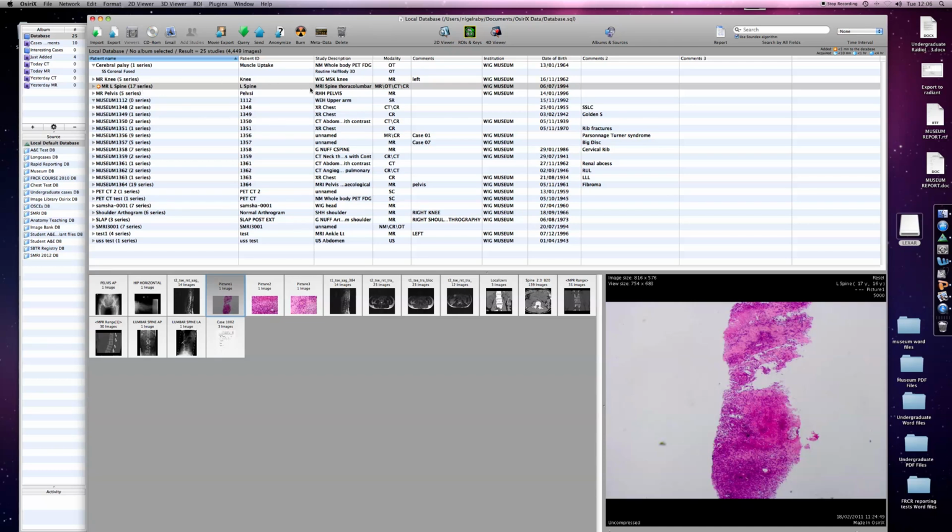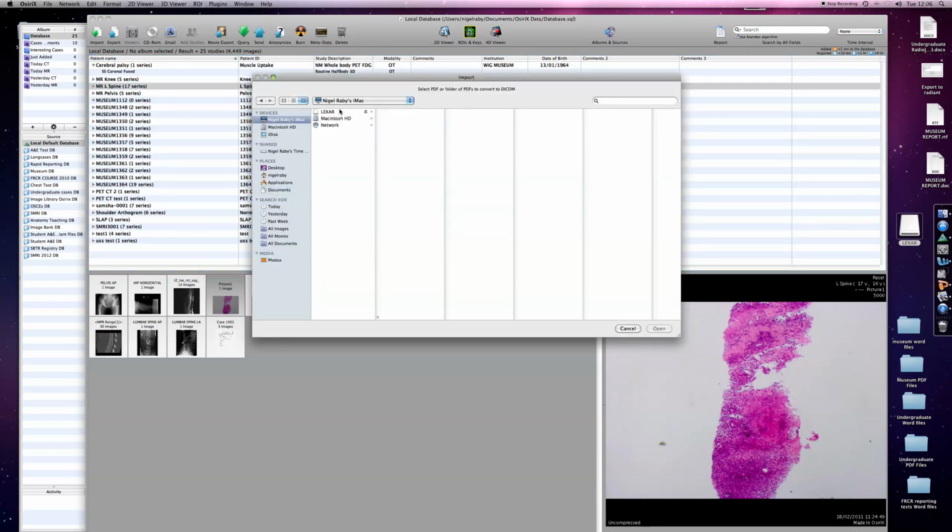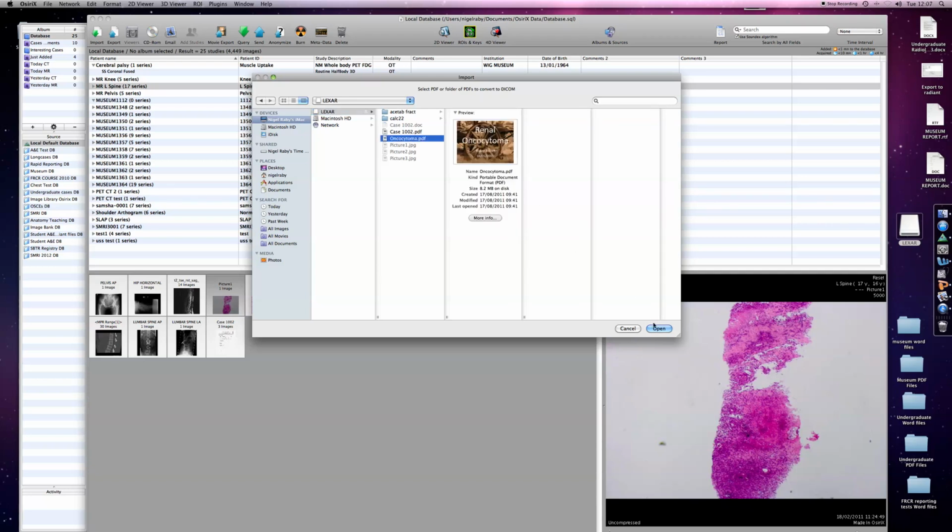The last thing I find quite useful is the fact that you can take a PowerPoint file, and there's a facility within PowerPoint to do the same thing, save as a PDF. So you can convert a PowerPoint presentation into a PDF file, and we've already done this. Again, it's a completely irrelevant presentation to the images, it's just an example. That'll be a PDF file. Navigate to my pen drive, find this oncocytoma PDF file. This was a PowerPoint presentation, simply saved using the PDF option.